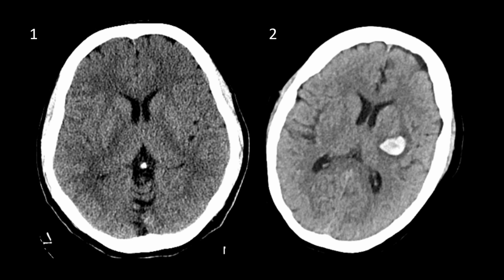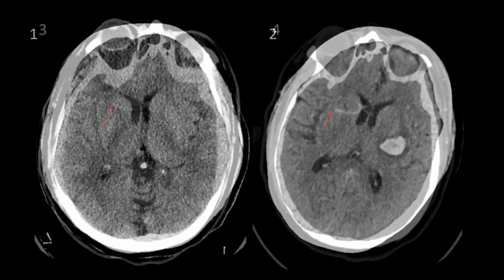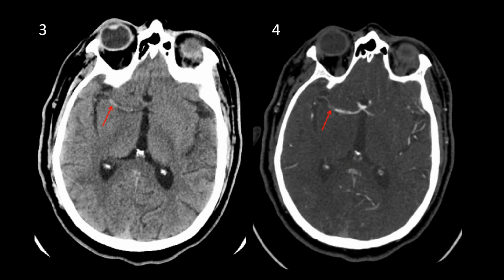That said, there are some signs of an acute infarct that can sometimes be seen in the hyperacute phase. One such sign is the dense vessel sign. The thrombosed area of the vessel will typically be hyperattenuating due to the clot having greater density than non-clotted blood, as demonstrated in the right MCA in image 3.